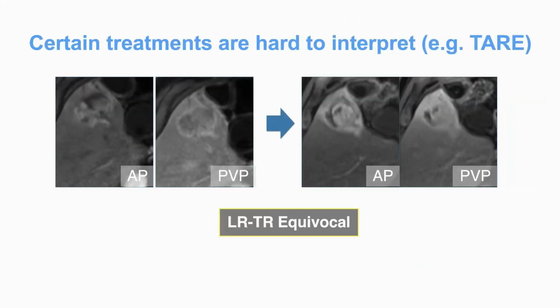Here's a case that's treated with radioembolization. And these are the ones that are most challenging, especially in the first 3 months when the embolization effects are still evolving. And this is something the Tumor Response Working Group is working on to provide more clarity in the next version or the next manual of LI-RADS.